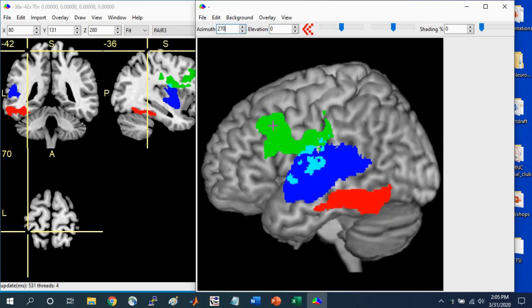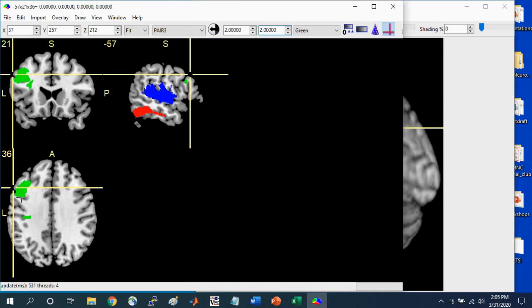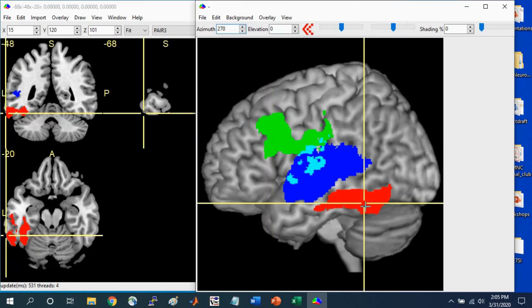So now we can see the left profile view, and we can left click on the screen portion, and it'll jump to the surface of the slice view where we have the sagittal, coronal, and axial slices. It'll jump to that depending on where we click in the rendered view. Working with this allows you to gain a better sense for where the lesion is on the profile view, so the surface of the brain, a surface rendering, relative to where you are in the slice view.